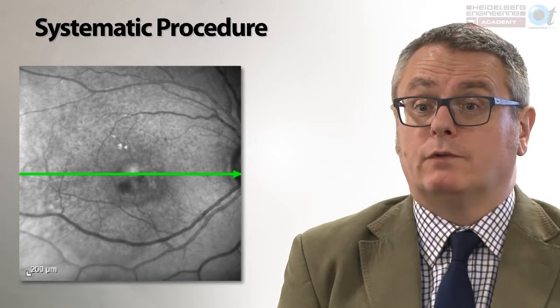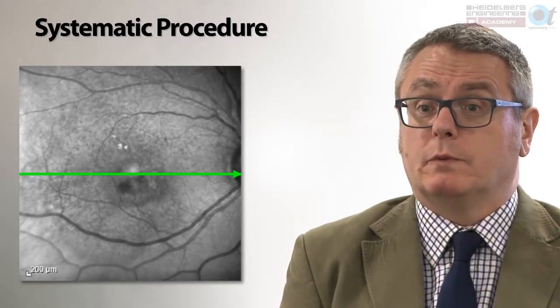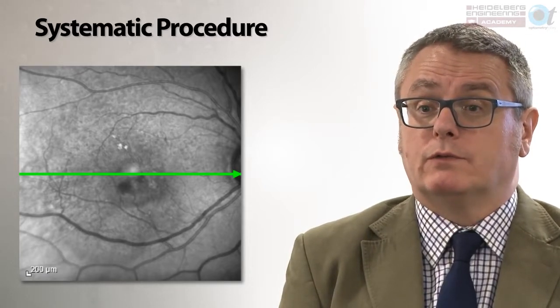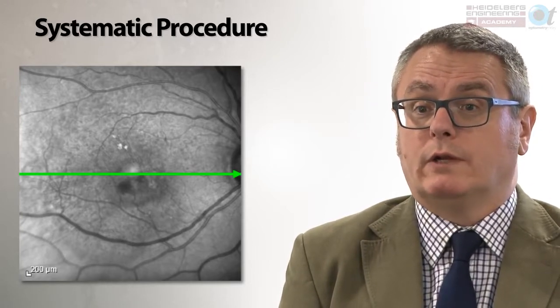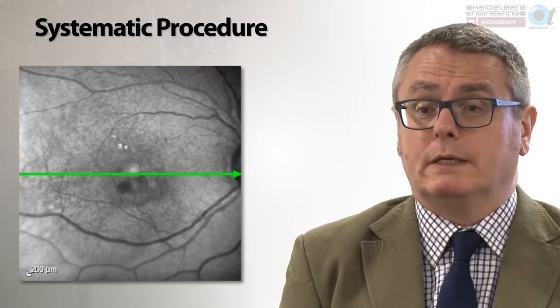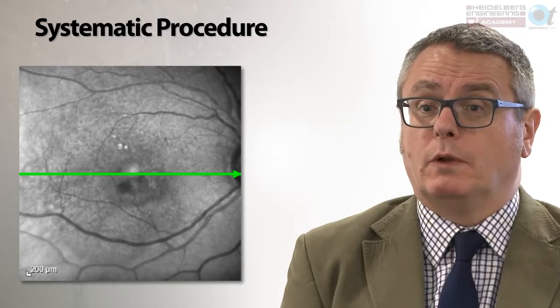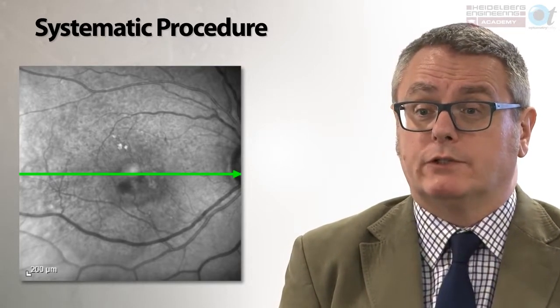There's a larger area of diffuse absorption around the central macula, which is most likely to be caused by intraretinal fluid. We can see some highly reflective structures, which is consistent with exudate. And throughout the retinal pigment epithelium, there appears to be a mottled appearance which would be consistent with a drusenoid type appearance. So what we're looking at potentially is somebody with age-related macular degeneration.